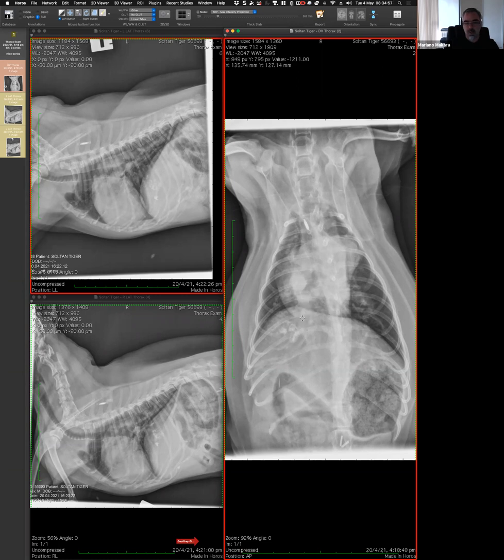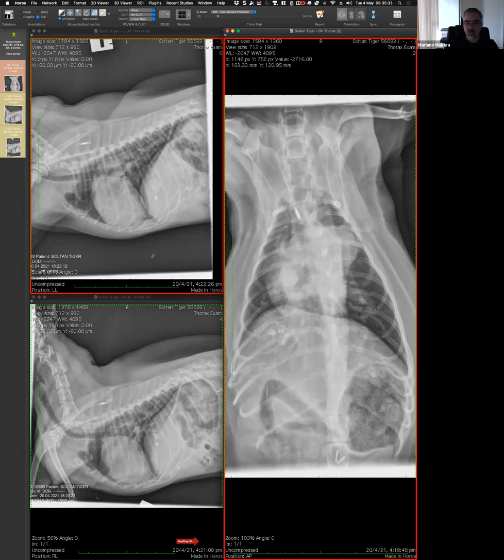So I think if these, instead of being the pulmonary veins, are the pulmonary arteries, and probably we get another one here, boom, going like this, tortuous, then we have a better fitting, makes sense? So now everything seems to be falling in place. Right-sided enlargement of the pulmonary outflow tract, enlargement of the pulmonary arteries. And I will probably add now that this big guy here, that's a pulmonary artery. And this is another pulmonary artery that extends all the way here. And this one, there is some degree of obliquity, and that is boring us.